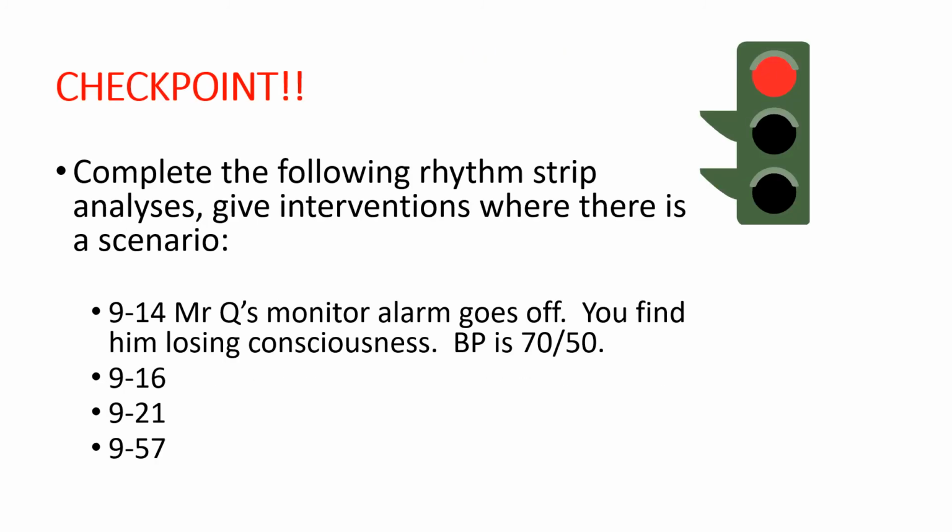So at this time, I'm going to have you do your practice strips. Pause the video, do your practice strips, and then when you come back, we'll do the review of them.